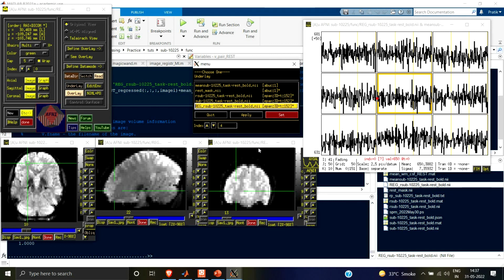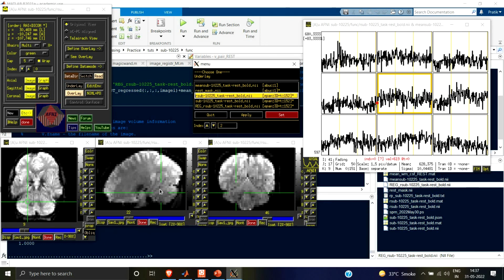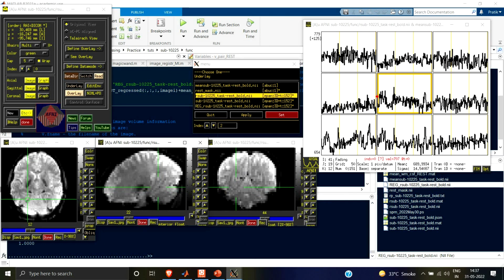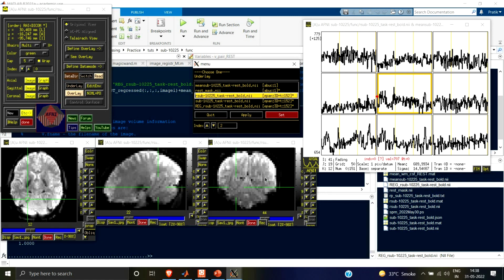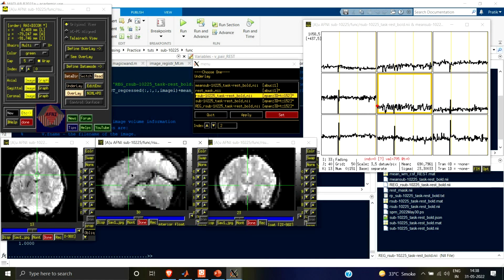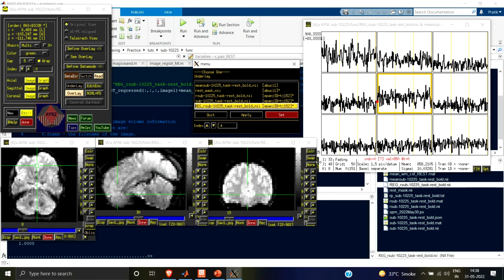A beautiful time series. Also, if you see, there are some unusual trends as well. You can see this trend over here, unusual trends. So this is also gone in regression. So in the regress time series, you can see there are no trends. These are just time series that are ready for analysis, right? So you can just compare both of these images, and then understand the importance of regression over here. Okay, so that's all for this video.